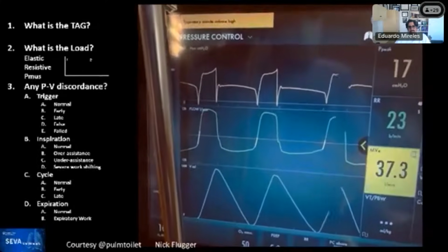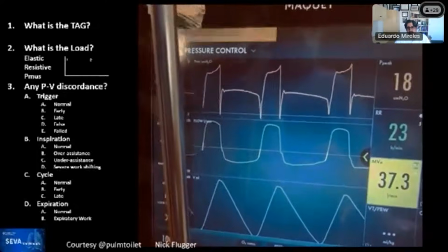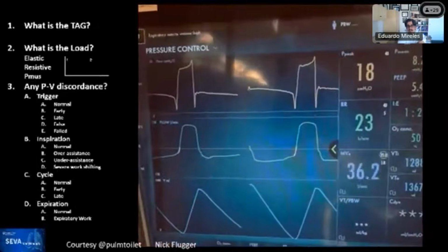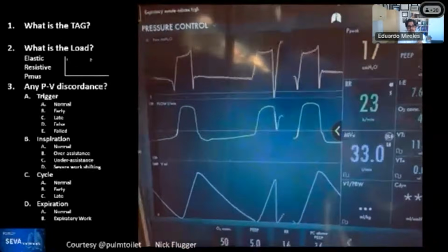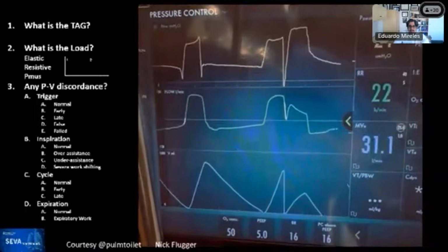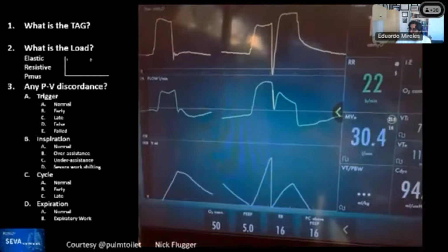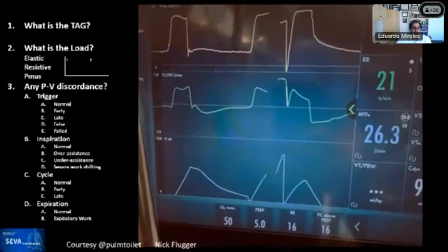And I guess this is one of those breath sequences that if you can read every single one of the patient interactions that occur through this, you're ready for practice anywhere, because it has every single one available in humankind.